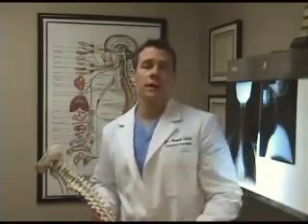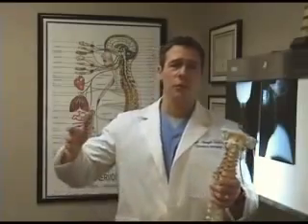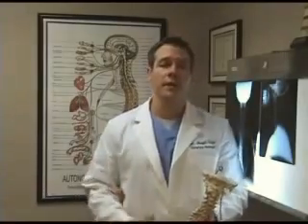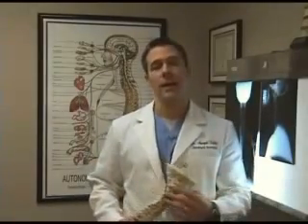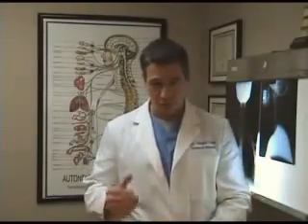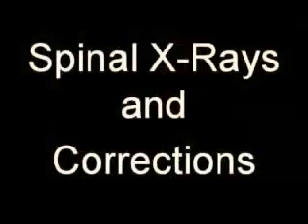So what I'm going to do right now is have you sit down and relax. We're going to zoom into a TV where you can actually see these X-rays nice and close up, and I'm going to go over all the different X-rays that we took, and I'm going to show you some examples of pre and post corrections of patients that just started care and patients that went through a corrective care program and were able to improve the structure of their spine.